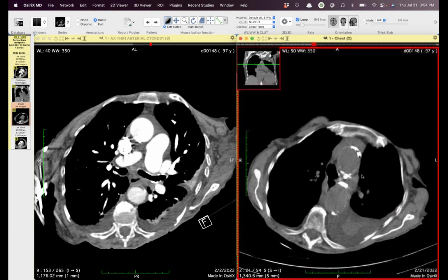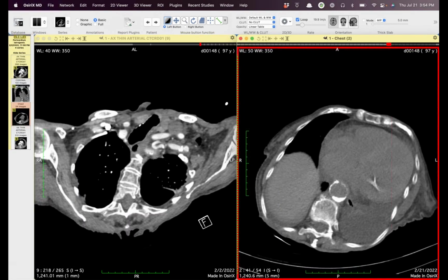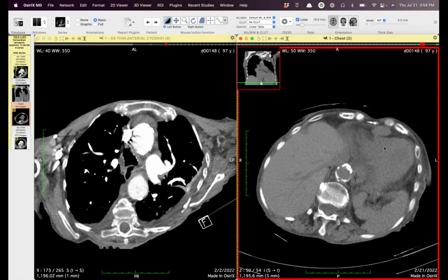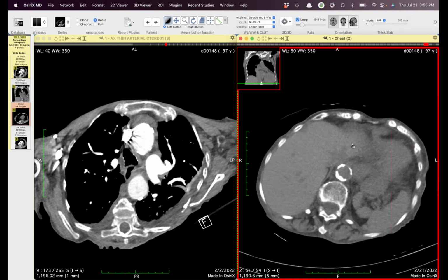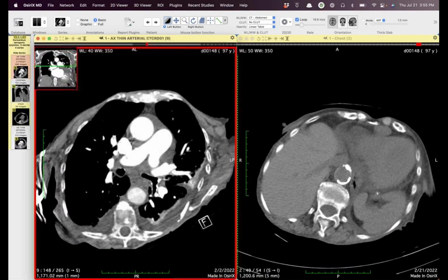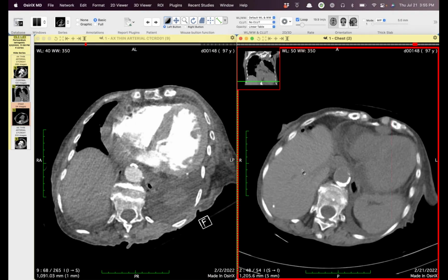And so that is the second. This is 3 weeks later, and this is still months ago. And you'll see, let me stop this thing sinking. Well, I can't. And look at that. So this thing has been there since February and was new on this one. And what it turns out, in the interim between these two studies, they did a pericardiocentesis to drain this pericardial effusion.